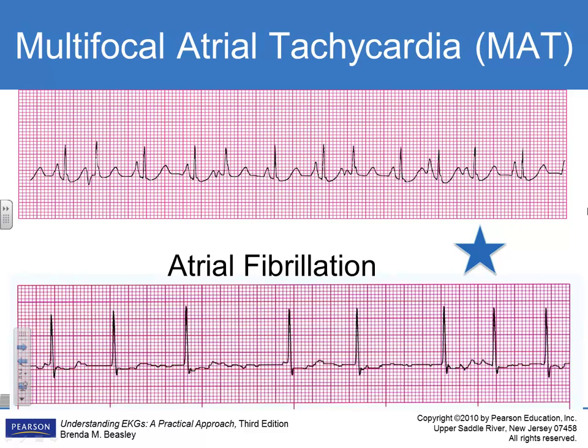This is atrial fibrillation, and we've not talked about that yet, but I wanted you to see the difference. Here you see P waves. Here you do not see P waves. That's going to be the main difference between those two.